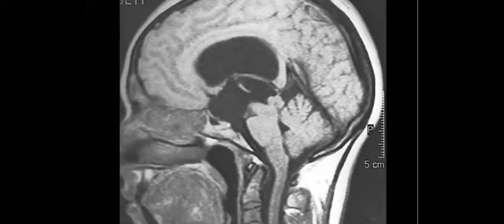Okay, I will just show you this one. So the level of narrowing will be at the level of the midbrain, right? You can say that it will be at the intercollicular or collicular level, right? Yeah. If it is acquired, it can be like infection, like meningitis. Okay. So the dilatation will be at the level of the lateral and third ventricles.